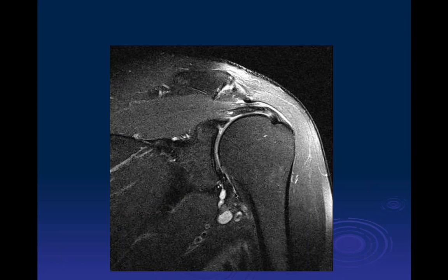When you see a labral tear, do you try to classify if it's superficial or at the base of the labrum? You mean whether it's closer to the bone or actually away from the bone, like at the tip of the labrum? Yeah, I certainly like to describe whether I think it's at the labral bone junction, or just within the labrum itself. And usually if it's at the labral bone junction, it's unstable and displaces.